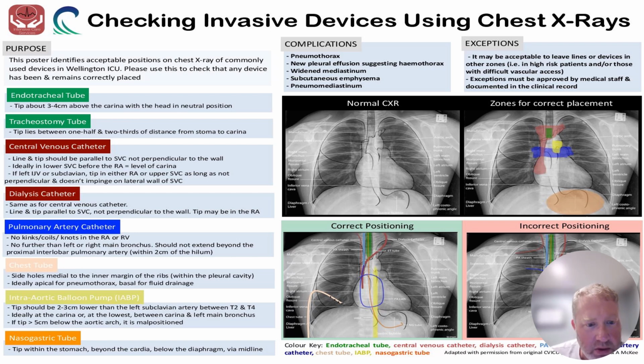This one here, let's see. So take a look at the different landmarks, the different markings, the different lines, and go through and as best you can with the size that you have, try to trace them. Trace the central venous catheter.